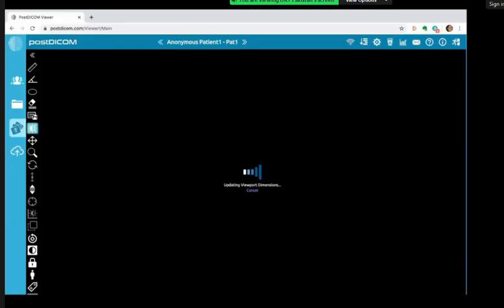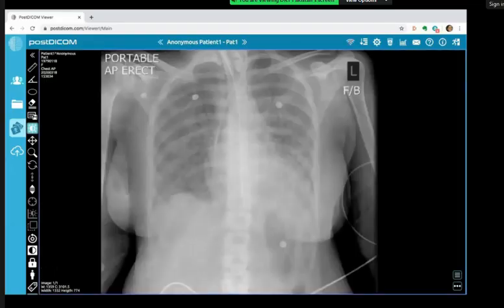There are a few lines. I think it's an NG tube, which I can only see projected at the level of the distal esophagus, which needs to be pushed down further to the stomach. And there is a central line which is projecting over the... Actually, it is going down to the stomach? Yeah, I can see it now. No, this is an ECG clip. Fine. So the NG tube definitely needs to go further in, doesn't it? And the central line is in the correct position.